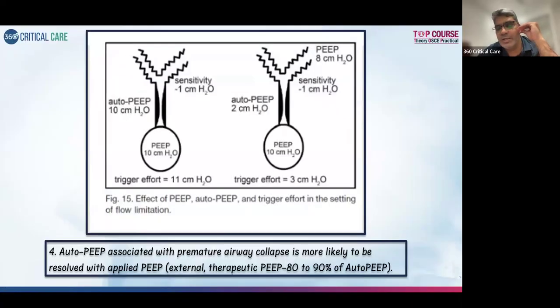That's about the ventilator waveform. So basically you need to practice the ventilator waveforms so that you can answer in a minute's time, looking at the patterns, and try to classify what type of abnormality the patient has, whether it is an auto-trigger issue, whether it is a trigger issue, a flow issue or a cycling issue. So those phases you have to identify.